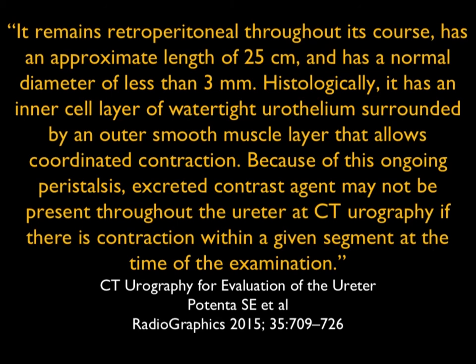Because of its peristalsis, it's very hard to catch the ureter always opacified unless it's obstructed distally. And we know this from IVP days that sometimes you would take 10 films to get the ureter opacified. I think with CT it's not typically the same problem because a dilated ureter without contrast is still easy to follow and look for transitions and look for causes. I like to think about a dilated ureter as a dilated loop of small bowel, where you're looking for the site of change in caliber and the cause.